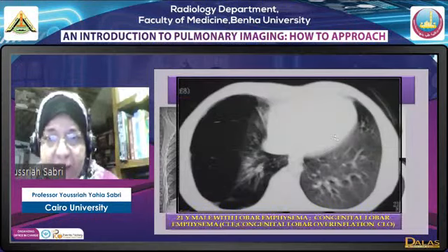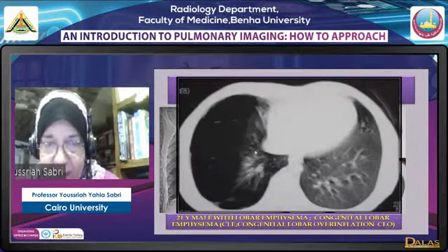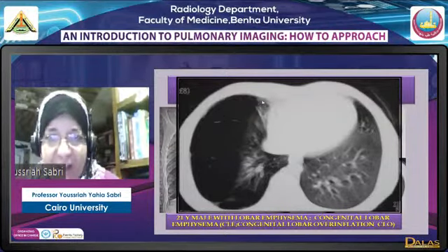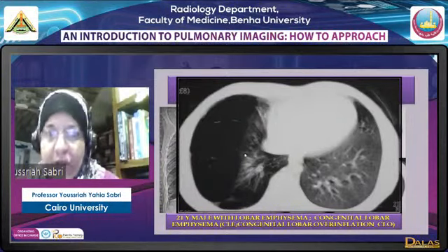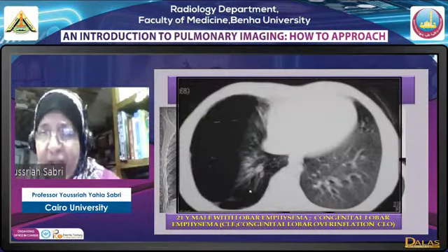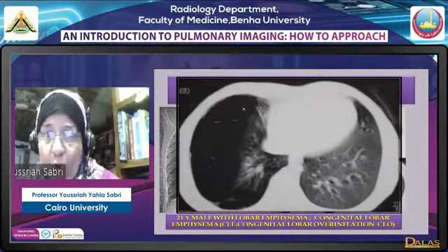If we go to the next images, we find that there is still lung tissue here. So this hyperlucency is not a pneumothorax, we have lung here, parenchyma and vessels, sparse but present, and we have this lung opacity. The lung opacity is demarcated by a line. A demarcation by a line means this is a fissure. The lung beside the heart is a middle lobe. The lung beside the spine is a lower lobe. They are both delimited by fissures, so we have a middle lobe and lower lobe collapse. This means that all what we see here is a hyperinflated upper lobe.